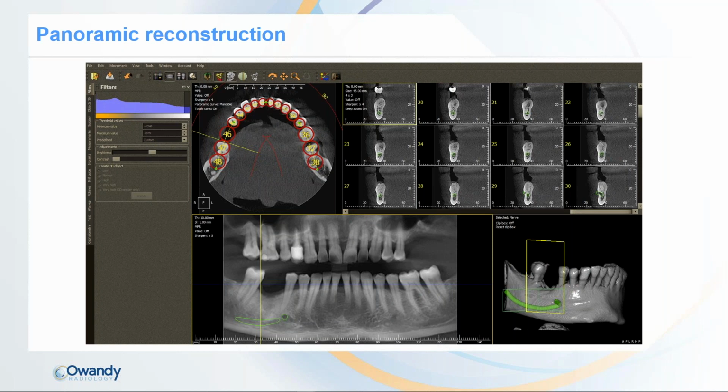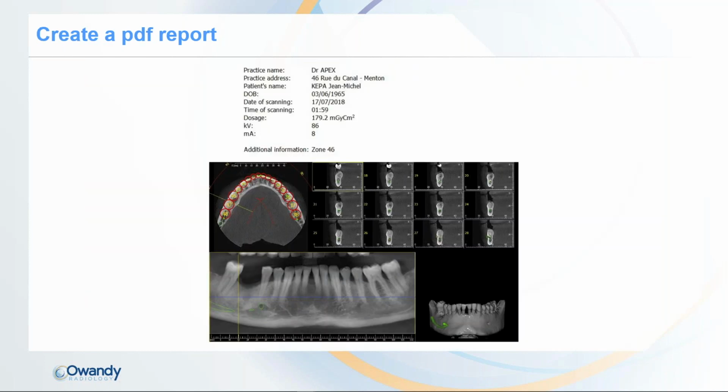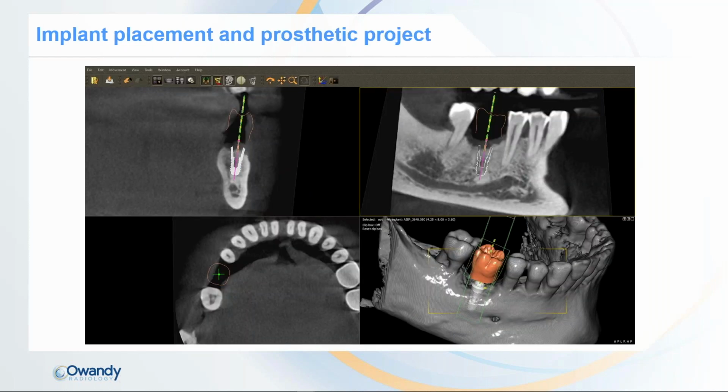Sometimes you may have heard about curved MPR, the curve along the arch, how to draw it and how to use it. You'll see how to create a PDF report, very light and easy to manage. For sure, we'll see the implant placement and the prosthetic project.